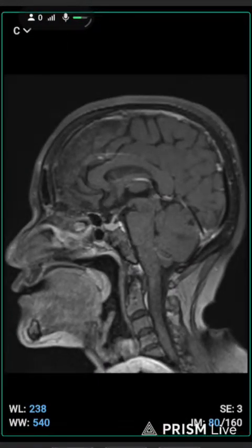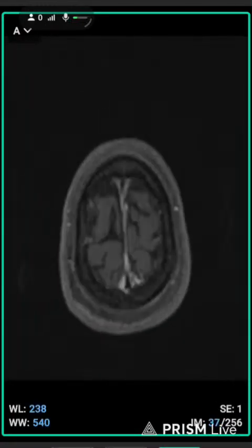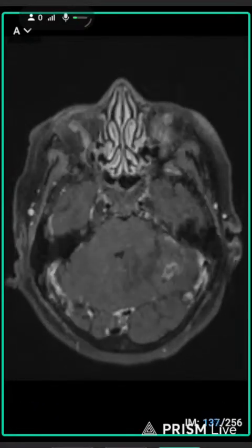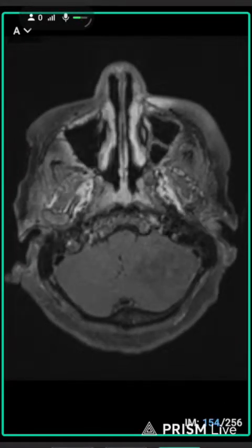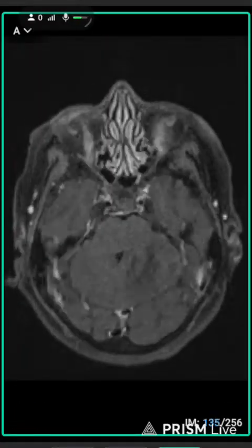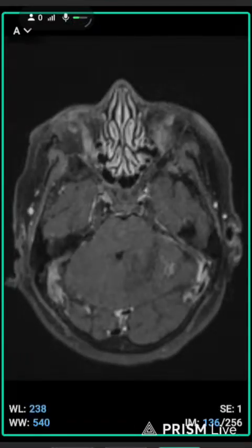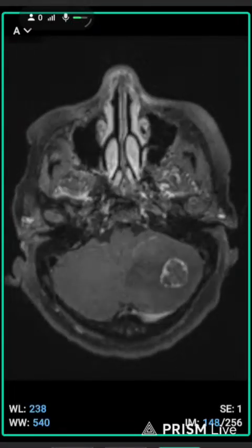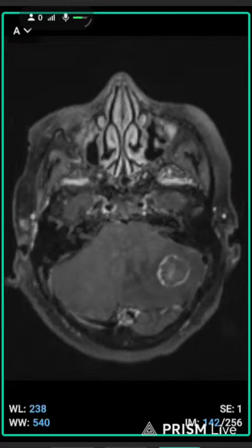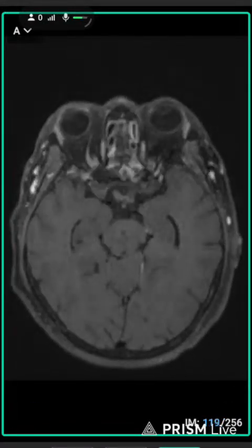You will see in the contrast image the area of the tumor was showing in T2 image, so it's more clear that the wall was clearly enhancing in this contrast. So it indicates that there is a tumor in this area, and after that the surrounding area was edema.